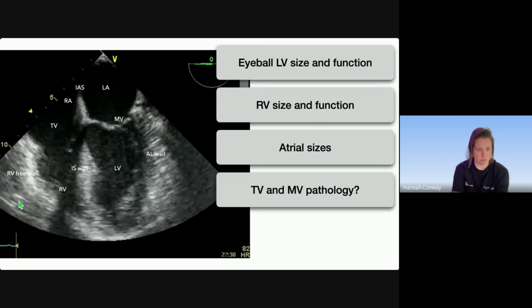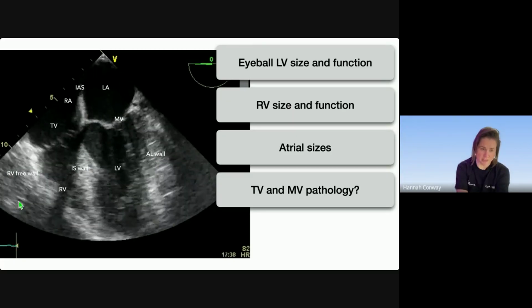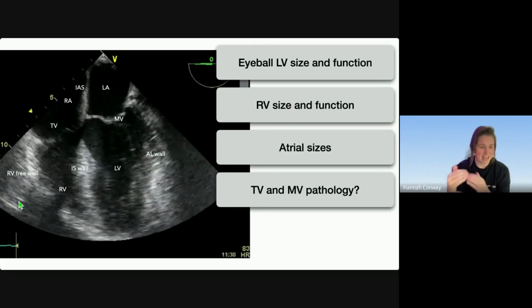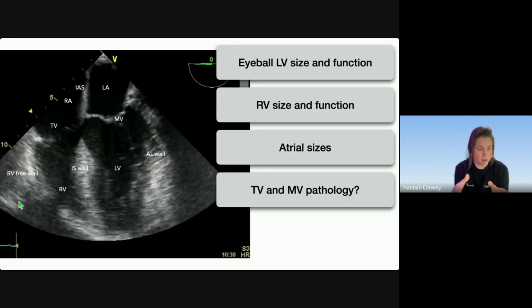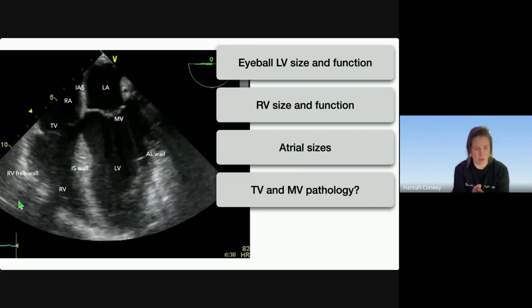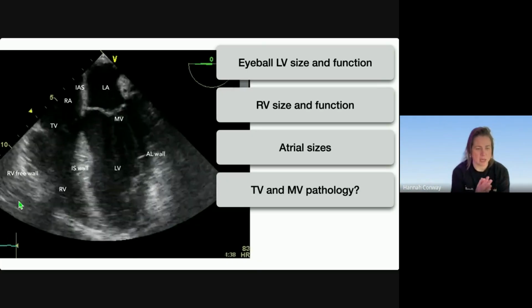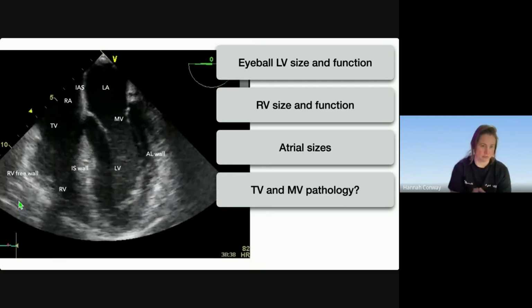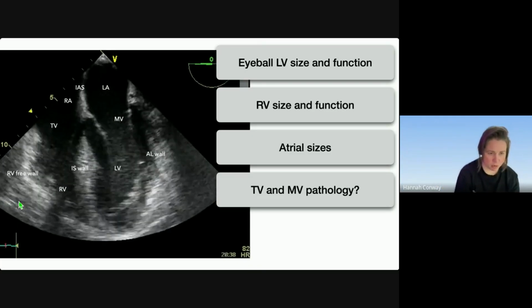I think the benefit with particularly mitral is that because of the resolution, we can actually make out potential pathology that's confined to a scallop, although we're certainly not expecting you to start identifying which is P1, P2, P3, but it is very helpful in certain pathologies such as prolapse, if you're able to identify if there's a prolapse of the central scallop versus lateral.